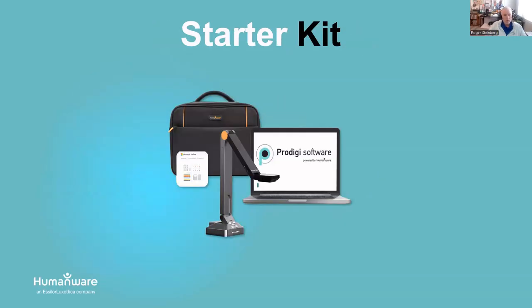The second is what we call a starter kit. So the items on the left of the screen here are the items that would come with a starter kit. And that's basically the Solo 8 document camera that you see to the foreground there. A Microsoft Adaptive Kit, which is the whitish box to the left center of the screen there. And this is a series of labels and bumps and cable attachments that you can utilize to place on your hardware, including the document camera, to identify different ports, keys, cables that you need, and it makes them easier to find and match as you need to do so. And a carry bag so that you can move around with that camera.